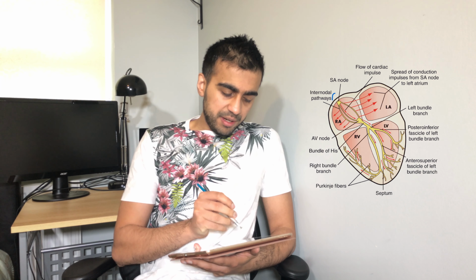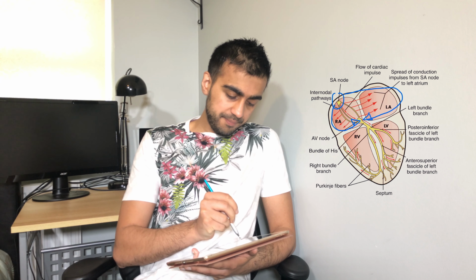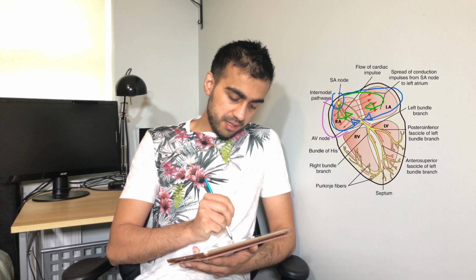And often second degree heart block actually presents itself with bradycardia, so slow heart rate, so heart rate less than 60 beats per minute. So the first one is Mobitz type 1, and Mobitz type 1 is actually quite a common presentation in certain exams because it shows that you understand this process. So in Mobitz type 1, the first impulse from the sinoatrial node conducts normally through to the AV node. And then the second impulse will take a little bit longer. And then a third impulse will take a little bit longer.